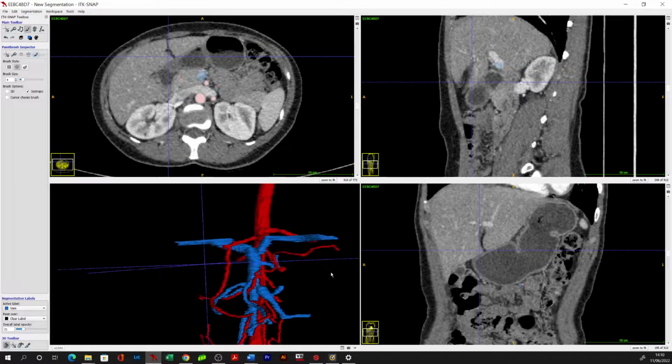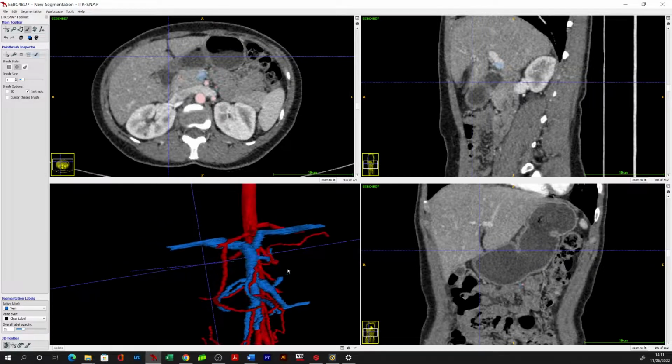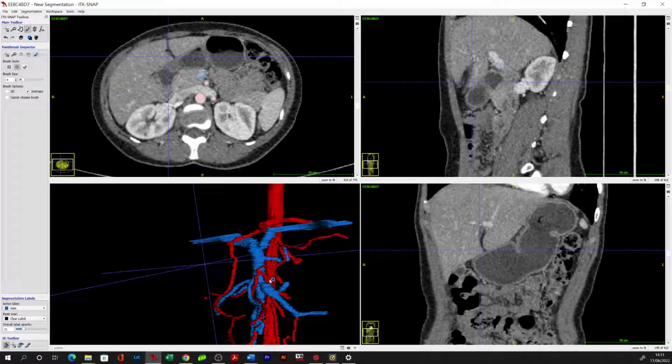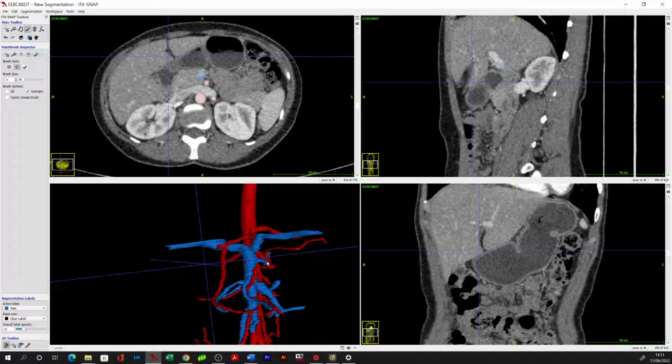In the operation, if you're doing a standard right hemicolectomy, this isn't relevant. However, if you were doing a more extended dissection, this may be more relevant. So in this situation, you've got one MCA trunk, but you've also got two separate MCV trunks, in that this vessel is accompanying this vessel, which is going to be supplying the distal transverse colon.